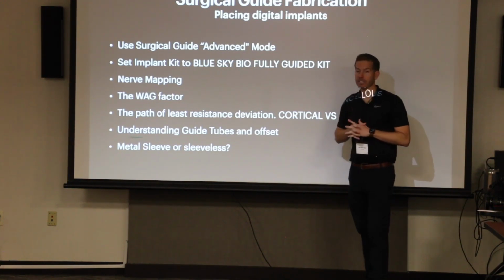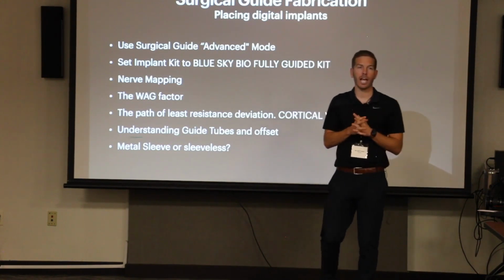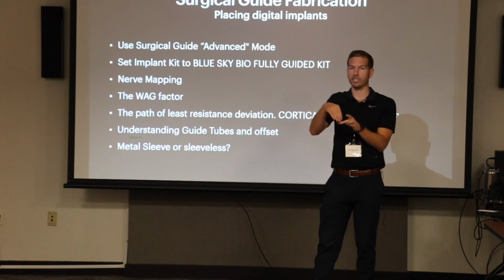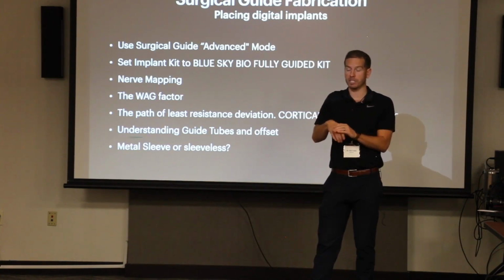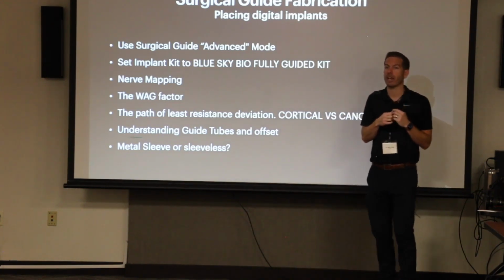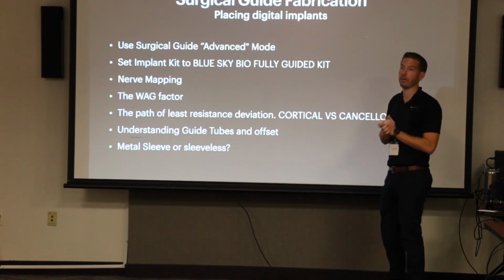The other thing to consider is I'm going to encourage people to convert to not using a metal sleeve, because you could see between the metal sleeve and that drill, there's a little bit of play. I actually print the guides without the metal sleeve and make it a little bit tighter, so that there's a lot of engagement, to the point where you almost can't move and get any of that wag factor. That's a personal preference, because the metal sleeve has a little bit of slop in there. So I'm going to show you how to do it without.